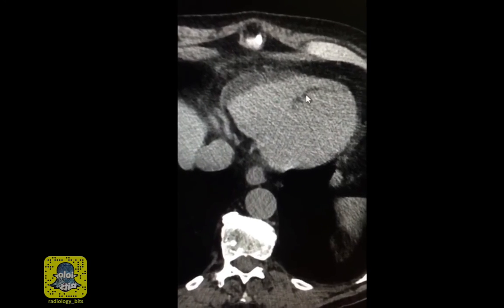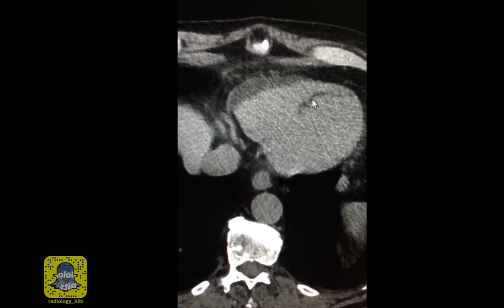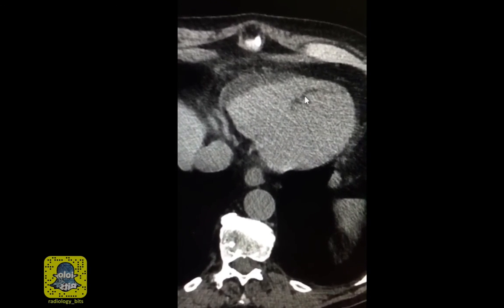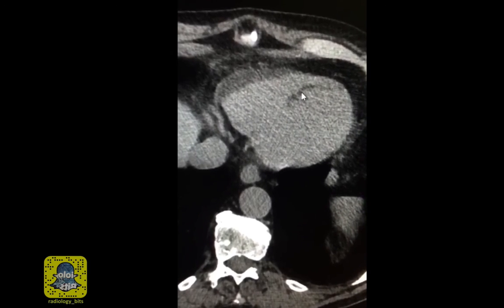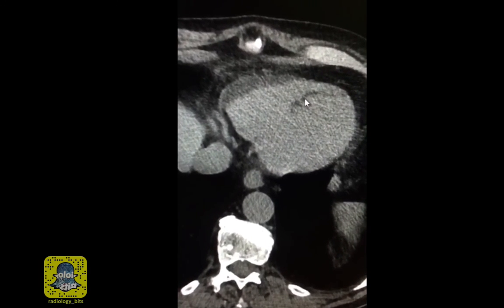The most common reason to have myocardial fat is an old myocardial infarction. As someone who's reading a CT scan, you may be the first person to report an unrecognized old myocardial infarction. This becomes clinically important, especially in patients who are diabetics who could have silent myocardial infarctions.